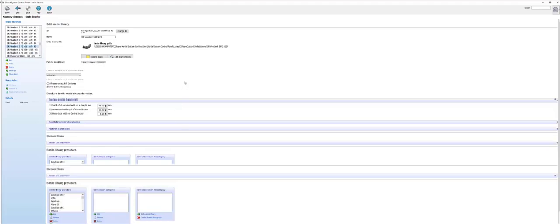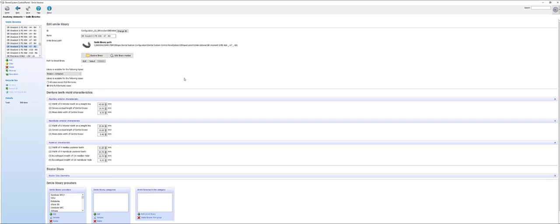For this example, I'm going to choose the SPE A66, A7, N5. Before I even copy this smile library, I'm going to go ahead and do some extra preparation ahead of time. So I'm going to click on Explore Library and back into my smile libraries.